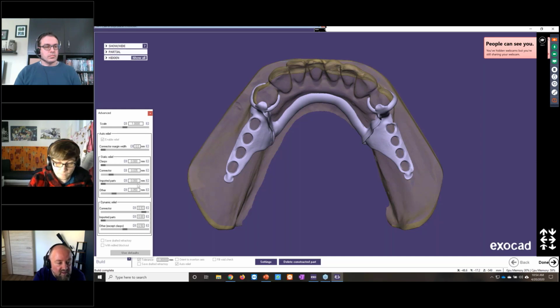I would print 3 or 4 partials and put a number on each partial. It's quite important. Otherwise, once you have found a nice result, you don't know the parameters anymore at the end. So write down the parameters you used with a number for each test. And then I would start with differences of, for example, 0.05 millimeters. So start with 0, then the second one with 0.05, and then 0.1, and then you can check the result on your physical part later.